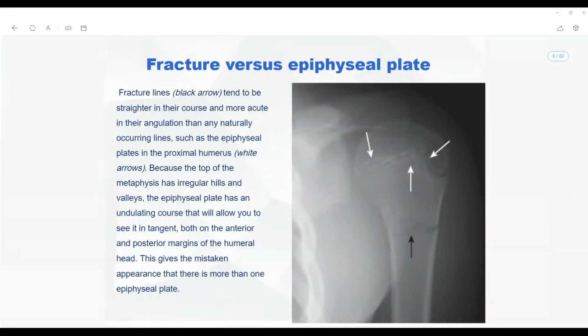That's true. You have to make sure, I am looking at the shoulder joint. First you try to classify the region. This is a shoulder joint. How can I recognize whether this is the right one or the left one?